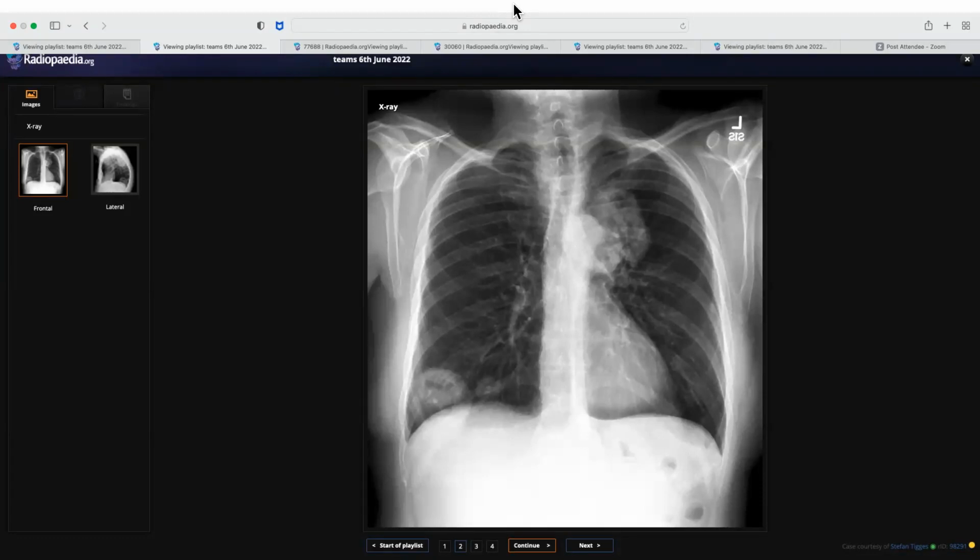So what differentials did you give other than granulomatosis with polyangiitis? I would say probably metastatic deposits. Which kind of metastasis can look like that? With large size, metastasis could be of renal origin. What is the characteristic of these metastases, you think? What kind of metastases are these? You mean the terminology that we can use? You described that they have central lucency. So yeah, cavitating metastasis. It could be cavitating metastasis.